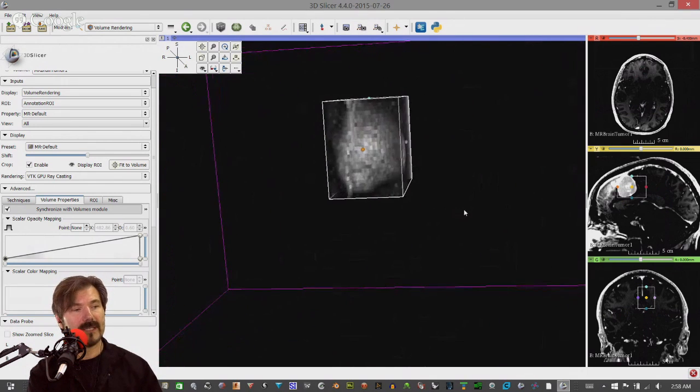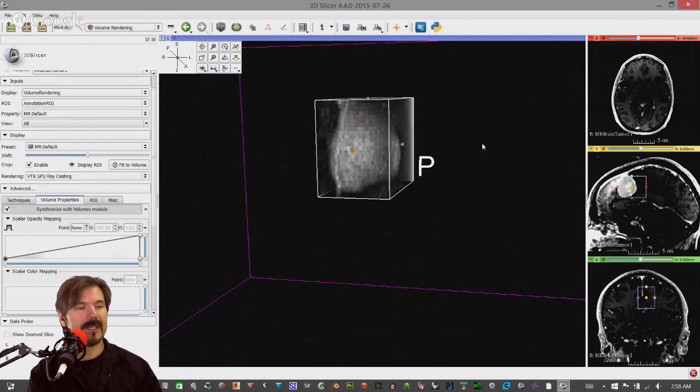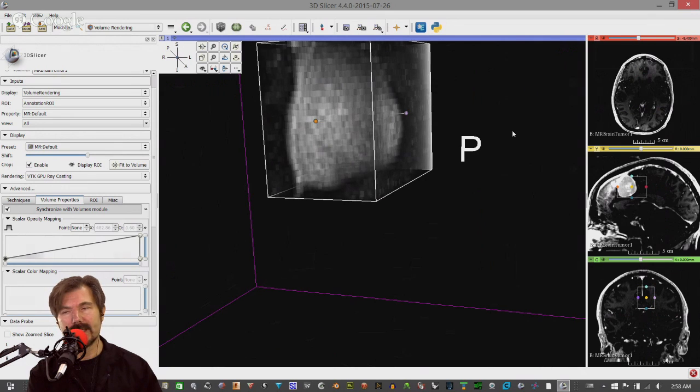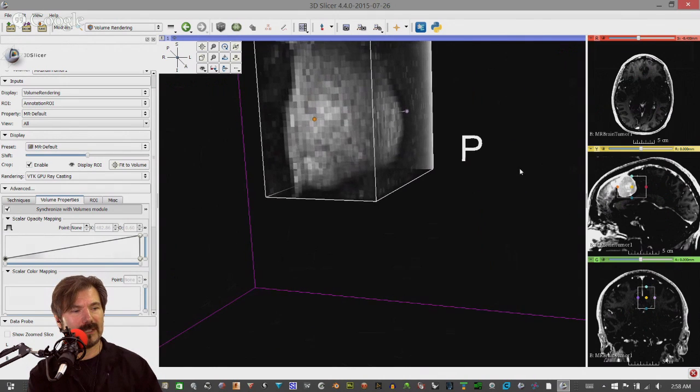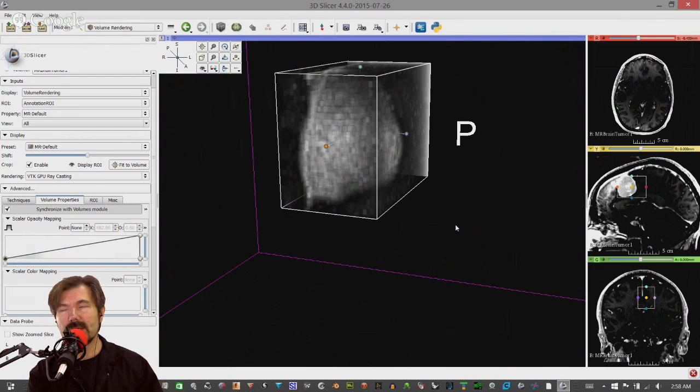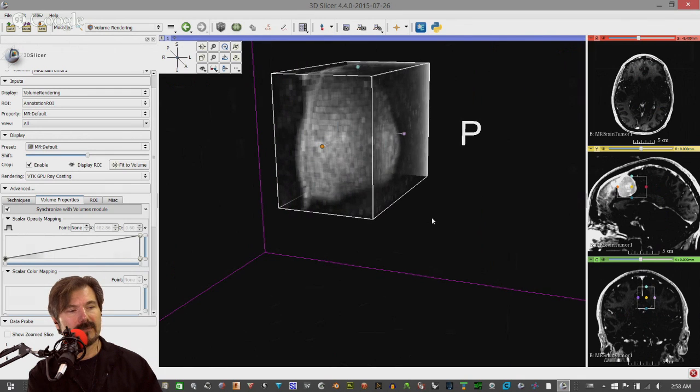So obviously we can examine. There are some measurement tools in there. But coming from an engineer background and designing things in CAD, sometimes two-dimensional surfaces work better for measurement processes than trying to measure in 3D space. But that is one of the strengths in some of these newer applications. So there's a good example of using the volume render. It's great for creating images. So if you have presentations, you can create a very realistic look, and I use that extensively throughout the last year. Jevin, do you have any questions on this?